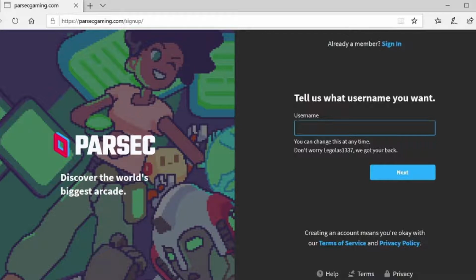We found it best to create your username with your dongle number included in your username. So as an example, if your dongle number was 52424, you might want to make your name homeuser52424 or your first name and last name with 52424 at the end. If needed, both supervising clinicians and home users can rename their accounts at any time.